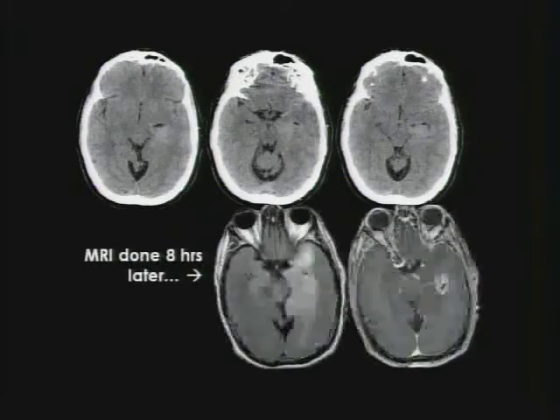Here's an MRI that was done 8 hours later, clearly demonstrating a necrotic mass with a subependymal abnormal enhancement, FLAIR imaging showing you extensive infiltrative tumor. This is glioblastoma multiforme. CT will never be able to show you this extent even with iodinated contrast, particularly this non-enhancing infiltrative disease. CT underestimates it, so just remember that.